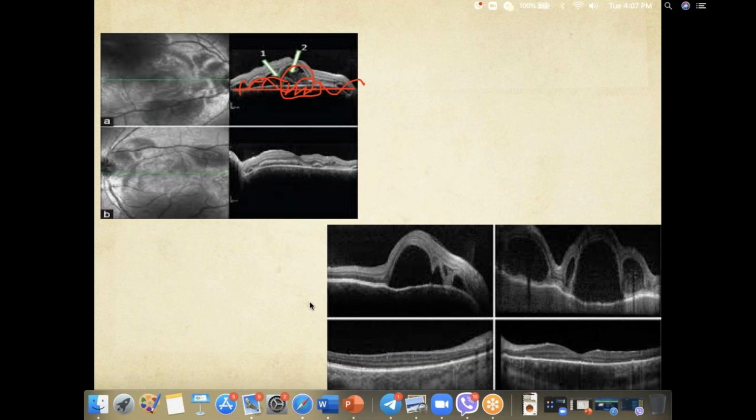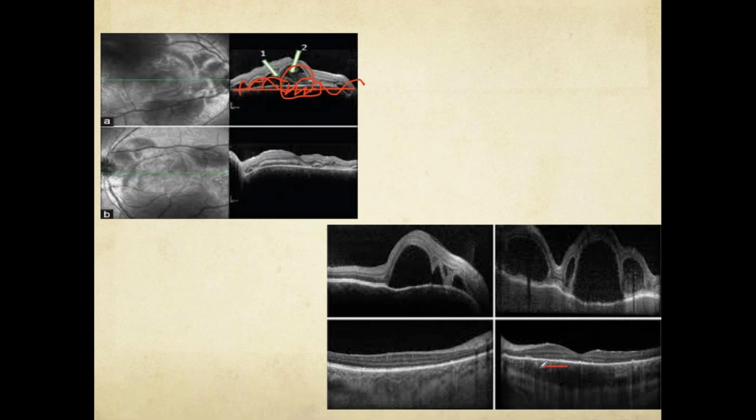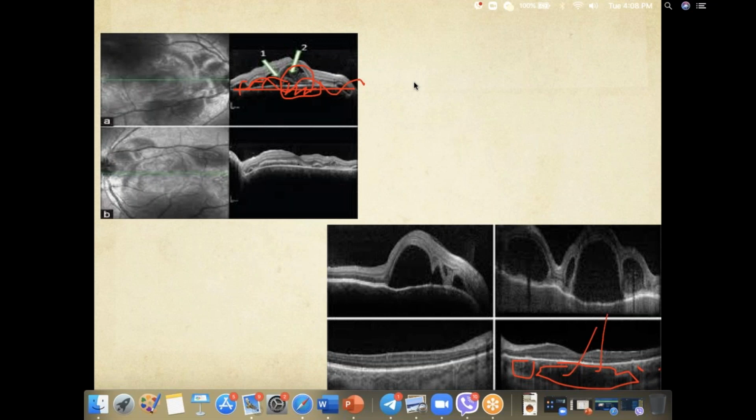Right? So after the injections, the retina turns flat, and when you do choroidal imaging, you find out that here you see the choroidal vessels dilating. These are mainly in this area compared to this area. Here is granular. Over here you can see big polyp-like pockets, right? So this is the polypoidal choroidal vasculopathy, where the vessels look like polyps in the choroid and they give impressions such as this. Fine.